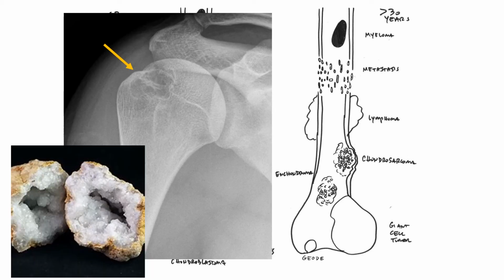This is a geode. This occurs when arthritis destroys cartilage or a tendon creates an avenue for fluid to travel into the bone. As the bone slowly expands, it creates an osteoarthritic cyst consistent with the appearance of a geode. A geode is a geological finding in bone in which fluid or another substance has created a central defect within a rock or a geological formation. Because the appearance is similar to that on an X-ray, these are called geodes.